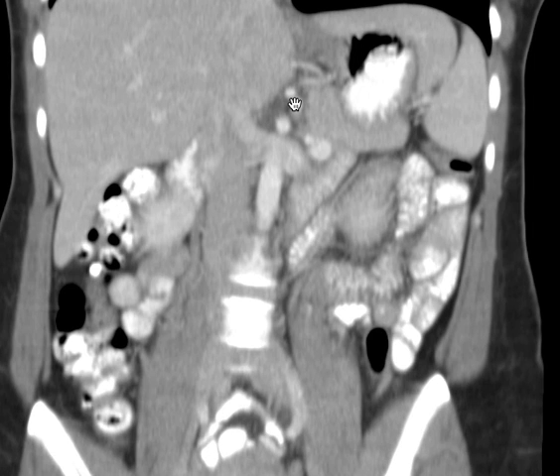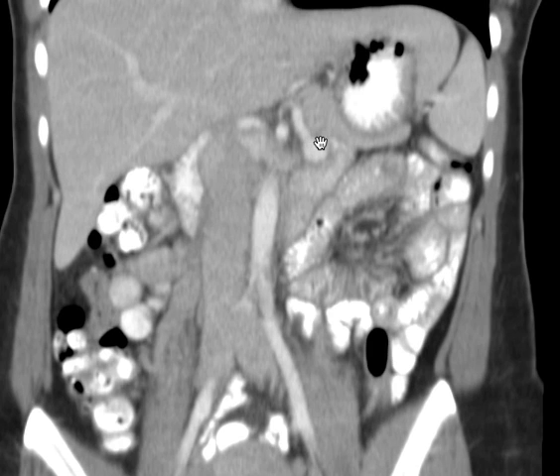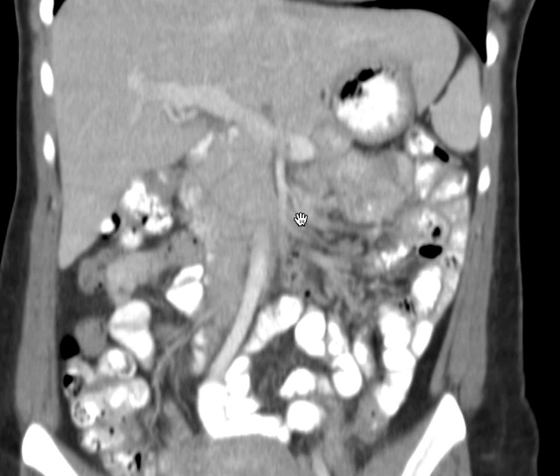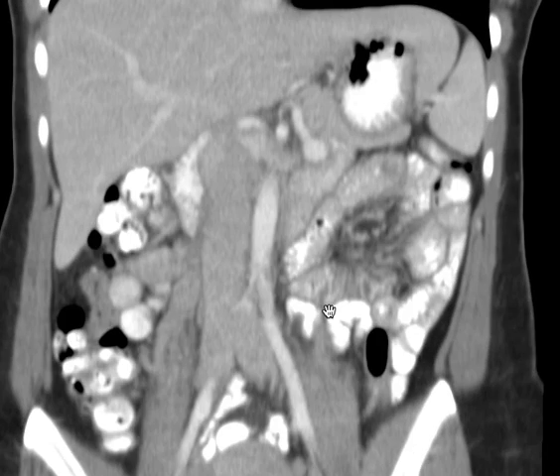The celiac axis gives off 3 branches, which you will know. And this is the superior mesenteric artery. And if we follow that forward, we see that it goes anteriorly and then it dives down like this. And so this is how arterial flow gets to the bowel.